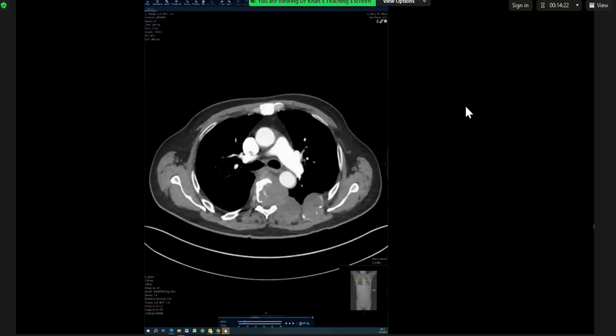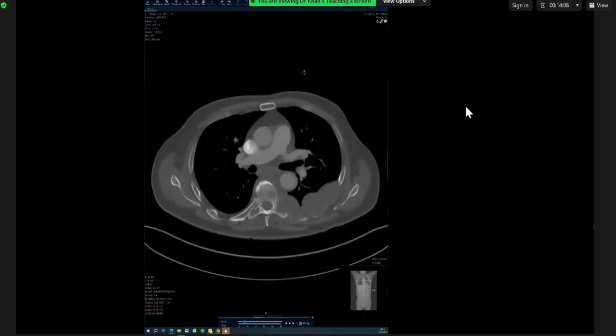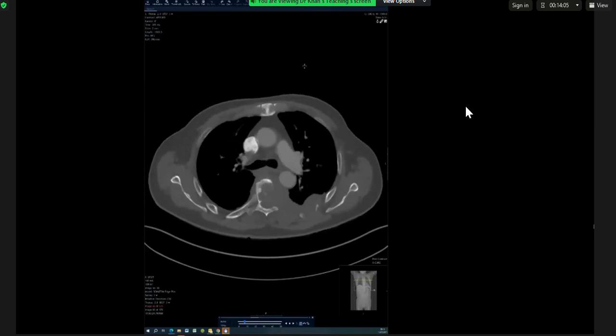And also here I can see that the spinal cord is involved with the soft tissue mass, and there's invasion of the thecal sac and complete soft tissue opacification of where I would expect the spinal cord to be. I would be very worried about spinal cord involvement, and I would contact the orthopedic team, alert them about this patient, and then follow up with further imaging, potentially an MRI, to assess the spinal cord. Okay, well done. Let's move on to the second one.